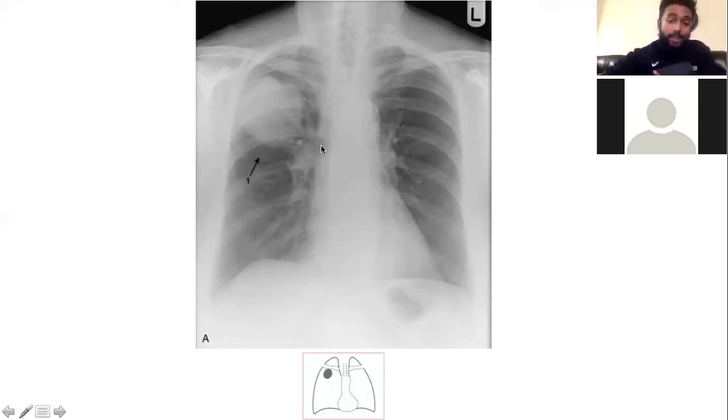Yeah. And I think it'd be definitely harder to say whether the lesion's in the middle or the lower lobe, as opposed to trying to get it from a middle to an upper. Because I feel upper is much more obvious, for me at least. Exactly. It seems more straightforward.